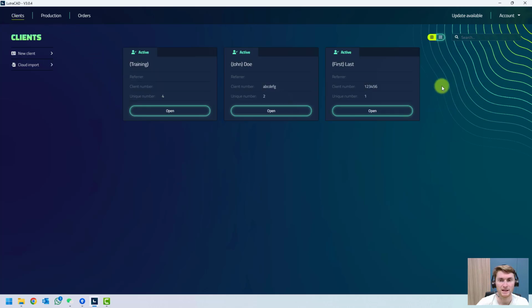So this way we made our first design. Creating a customer, adding scans, creating a design, applying corrections, and then adding it to our production list.